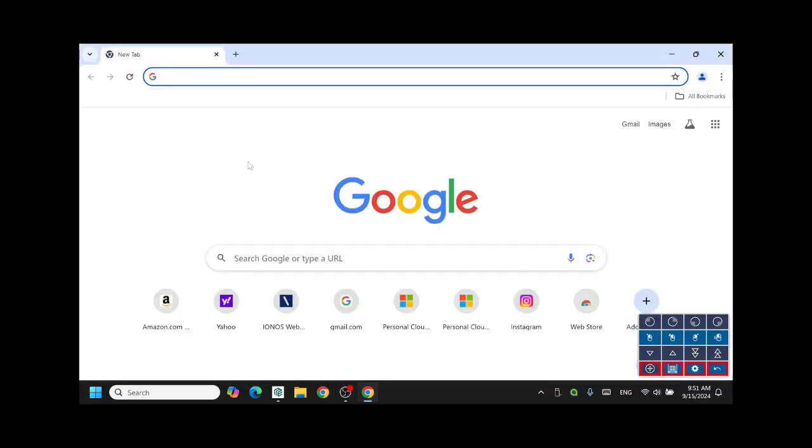I want to open Amazon, which is in the bottom left quadrant of my screen, so I will select the radar mouse with the bottom left quadrant shaded in. Then I will select a single mouse click to open it.